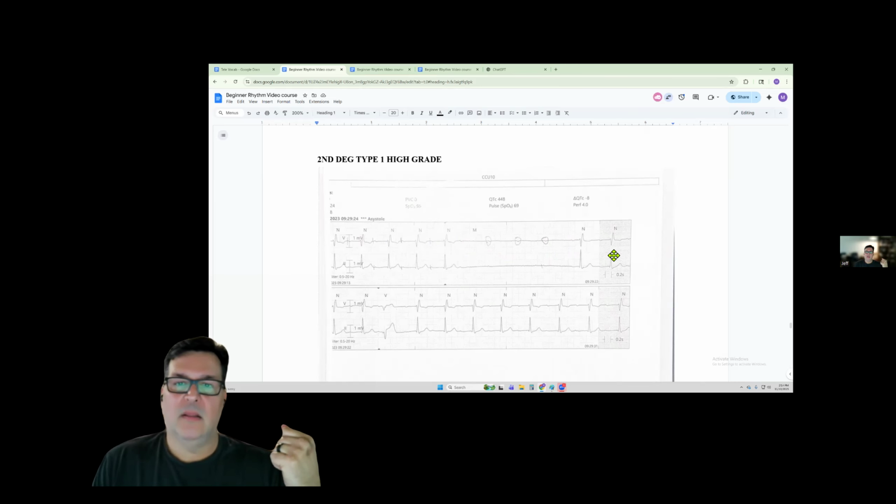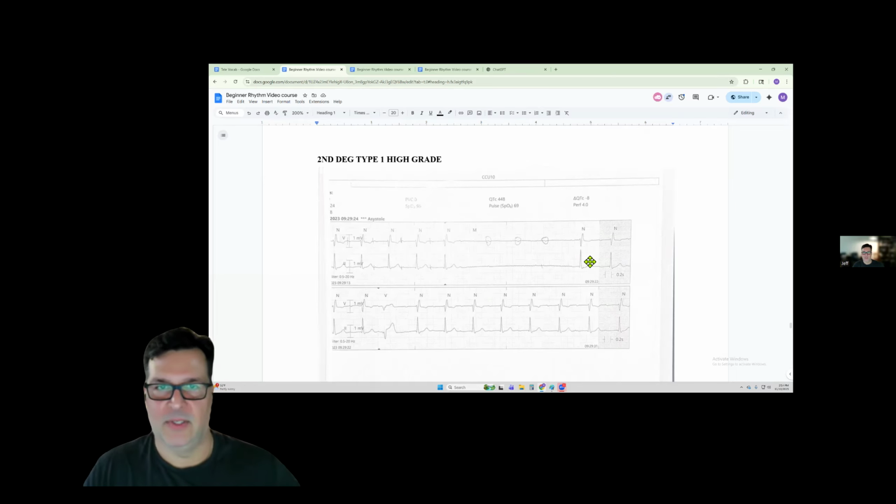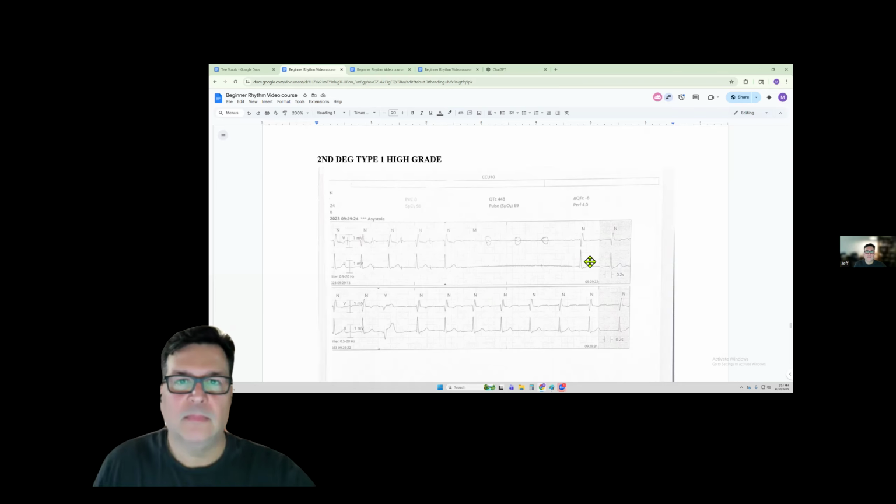But then, just because it rings asystole, you want to look at why did it ring asystole, right? You could just say, hey, they had a pause. That's just kind of an umbrella term. We could probably find a better label for that. Look at the rhythm and say, why was there a pause? What's actually going on?